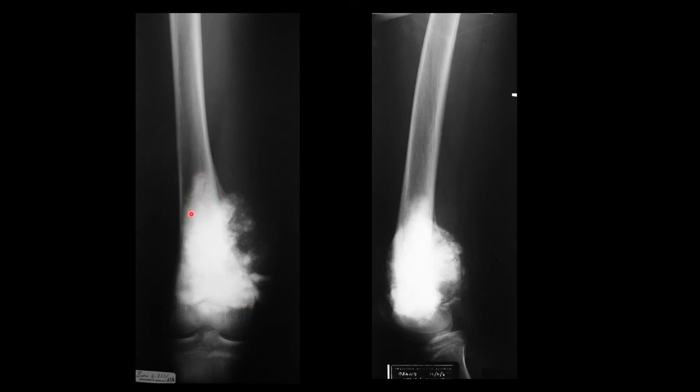You've got the most osteoblastic or sclerotic lesion you're going to see involving this distal femur. You can put a measurement to that, 10 centimeters by 5 centimeters. It's difficult to see the shape, although it's well marginated at the bottom here where it strikes the physeal plate. It's extending up the shaft in the medulla. It's extended beyond the borders of the cortex.